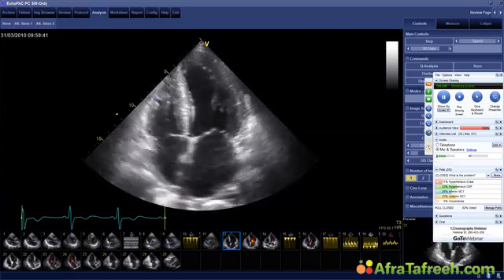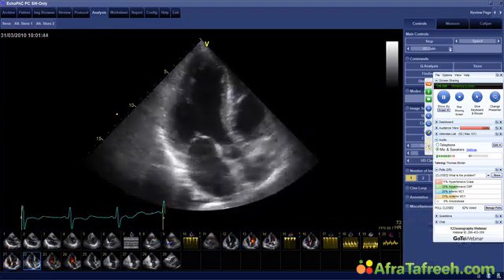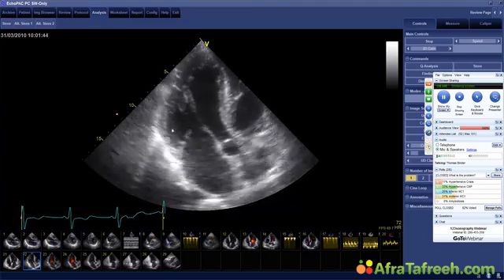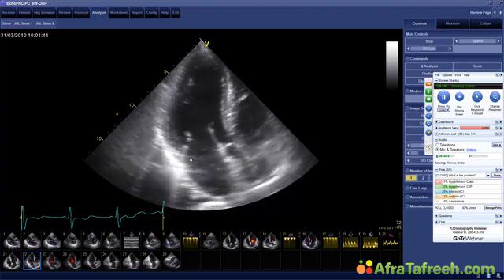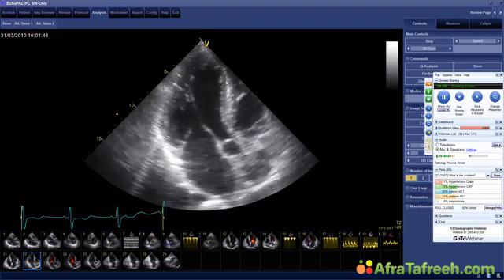So to assess the entire left ventricle, we need, aside from the 4-chamber view, also an apical long axis view. And this is an apical long axis view showing you something very similar. We have differences in the way the myocardium contracts. This part contracts very nicely at the basal part of the posterolateral wall. And this seems to be okay as well, but the problem seems to be here in the septum.